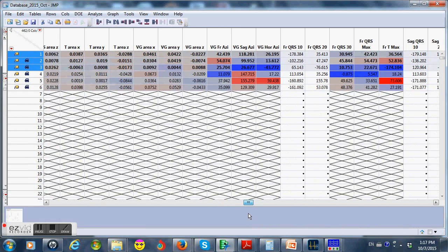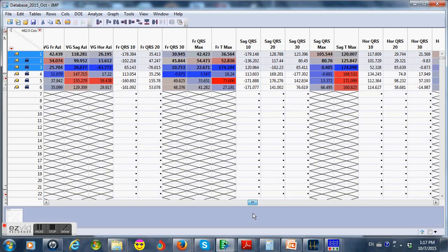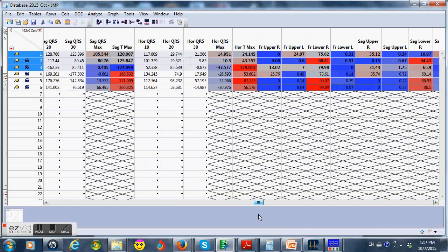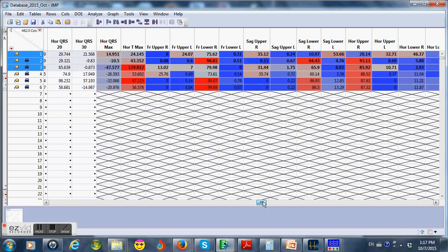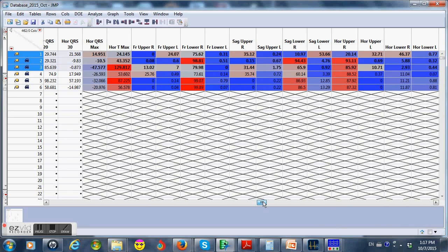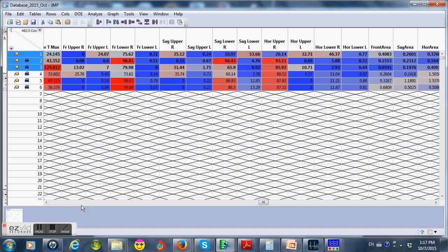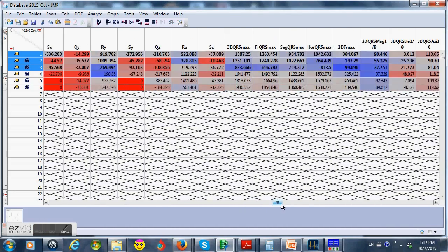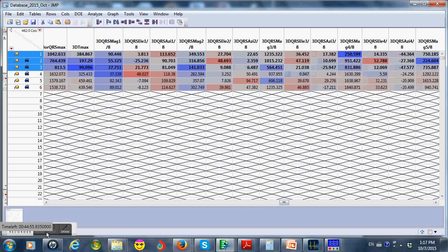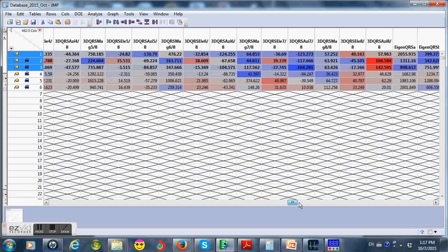This is really big data as we slide through just to show you the variety of parameters. Way too many to explain. We graded them, you can see the colors there in terms of high or low, or where they stand in relation to the underlying healthy population in the database. So let's just finish up scanning through some of those 3D ECG parameters.